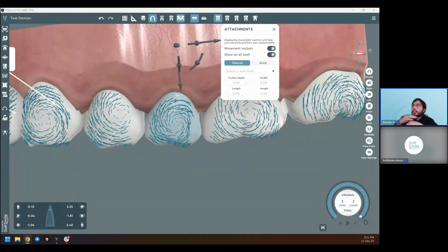So for a moment, yeah, that depends on the type of movement you are trying to achieve. That's also accurate. Yeah, and for the movements that I've introduced here for demo purposes, which is pure distalization, it appears that there are a few configurations that would work best. And as long as these configurations are following the two rules of thumb, which I said was, first, the attachment engages, so the active side of the attachment is perpendicular to the arrow, and it's located in a place where the density of longer arrows is higher.